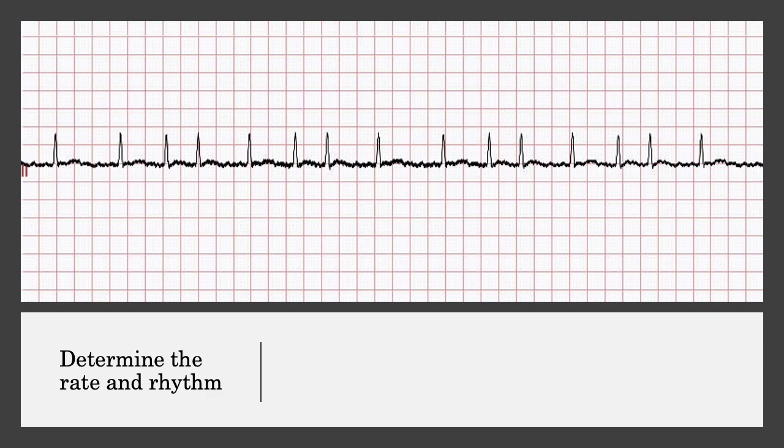Well, we don't have a full 12-lead ECG here, but if we were to do that, this is an irregularly irregular rhythm, so we would have to count QRS complexes over the course of the full 10 seconds of the ECG, and then multiply that by 6, which would then give us a rate of about 110 beats per minute with this tracing. So we know that our rhythm is irregularly irregular.